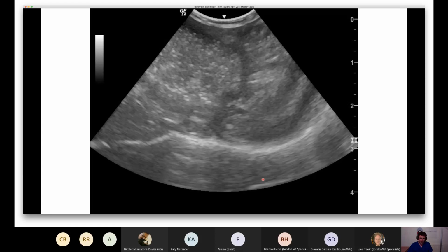The right lateral view is not always the best to evaluate the pylorus. The pylorus is on the right side, so really you want to ideally get a left lateral view, so all of the gas goes over to the right and highlights any foreign bodies that might be present within the pylorus. In this case, we didn't take any additional radiographs. We went straight in with the abdominal ultrasound.